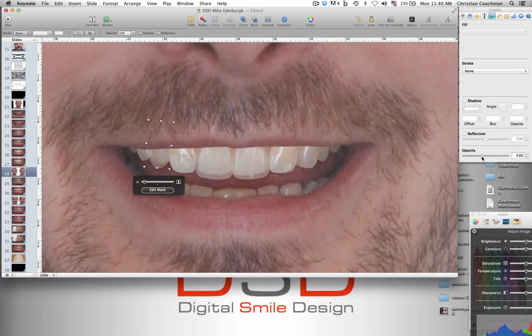If you're doing soft tissue there as well, you could take away the lip. Yeah. So you can go back and forth on these pictures. Those measurements of where they are in relation to the pre-op teeth give me where my wax.